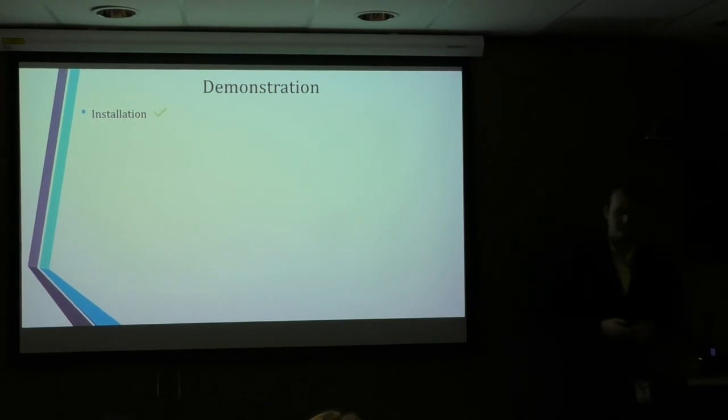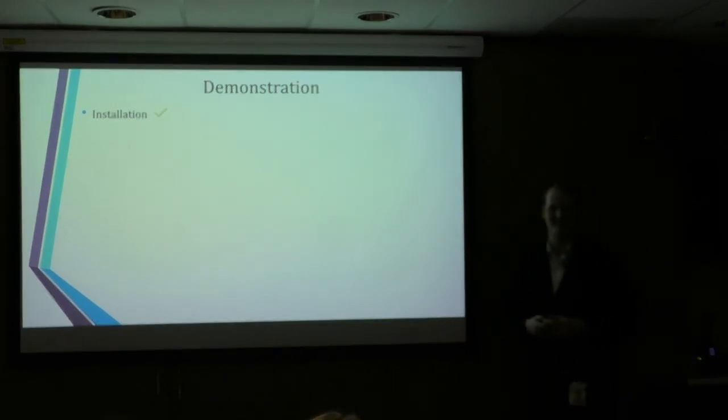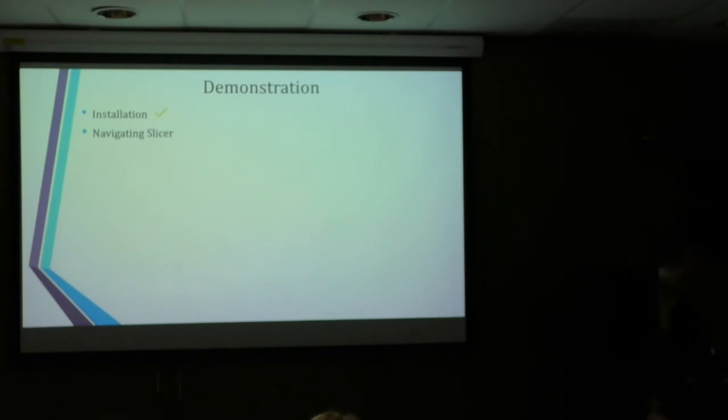So now that we've gone through the installation very quick, very easy, we'll go into the navigation of Slicer itself. So this will include just a quick run through of what you're going to view.